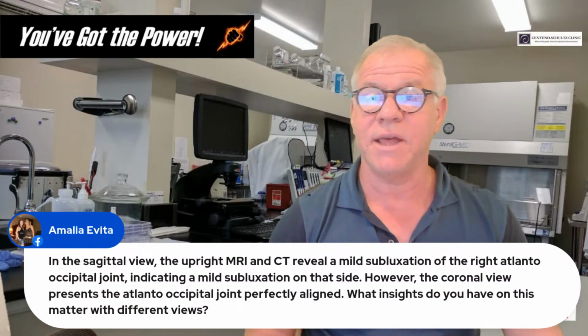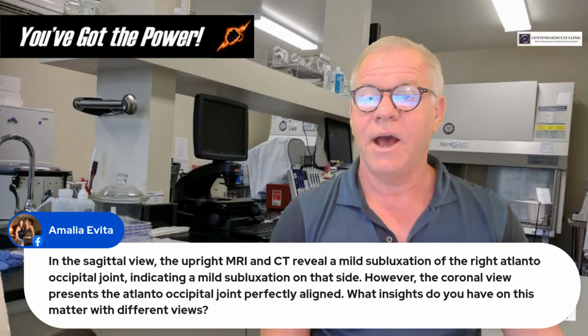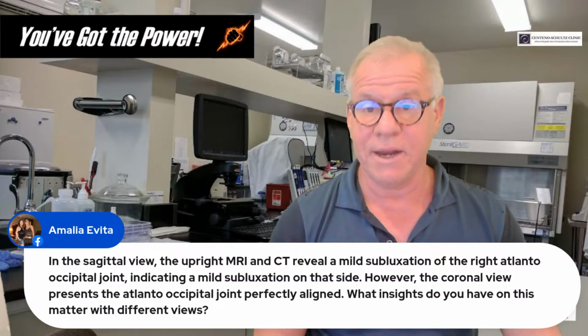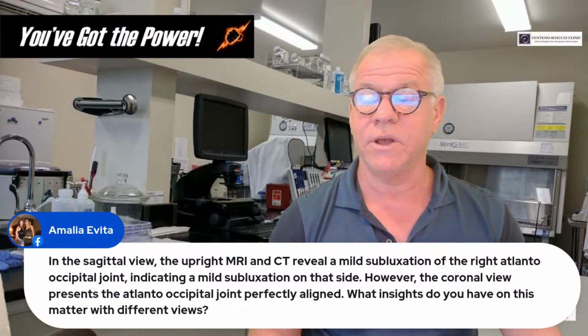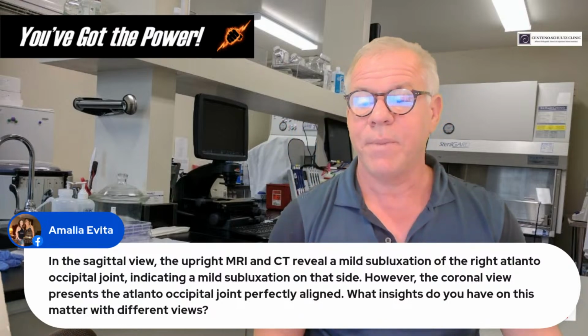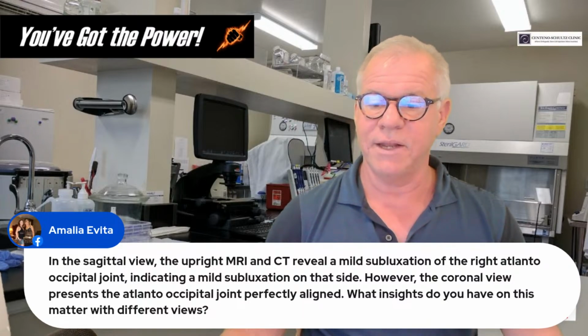It means that you're seeing some rotation in those bones. That may explain why some symptoms are happening, or it may not. That may be important for an upper cervical chiropractor to look at how best to get C1 and C2 back aligned, but probably doesn't mean a lot with regard to determining if you've got instability.